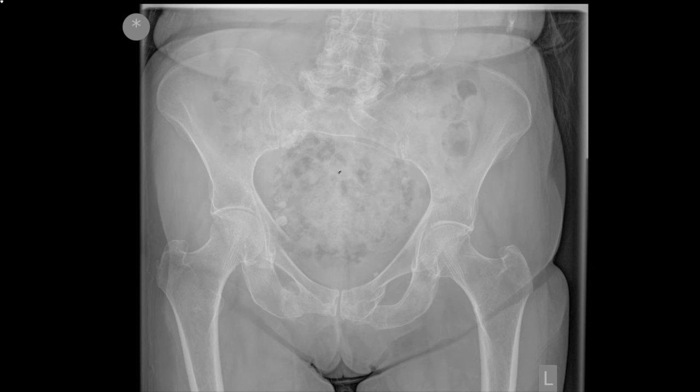Incidentally, on this radiograph, there is an aortic aneurysm, as shown by calcification in this rounded structure on the edge of the film. So here this patient has an aortic aneurysm, a calcification within its walls. This also shows the star placed on the image by the radiographer, showing that he or she thought there was a significant injury.